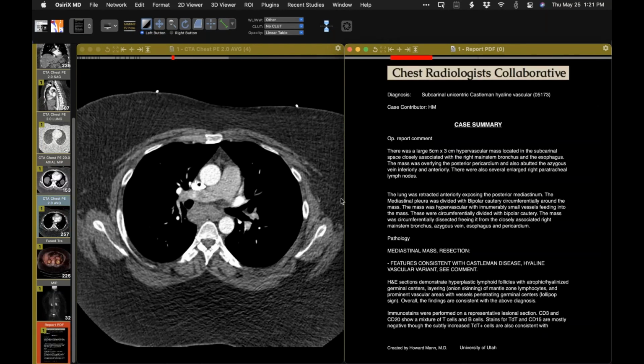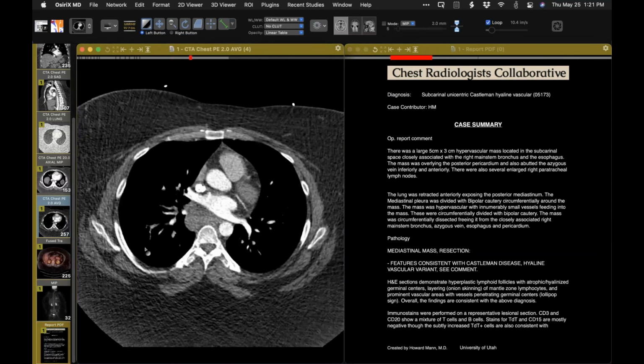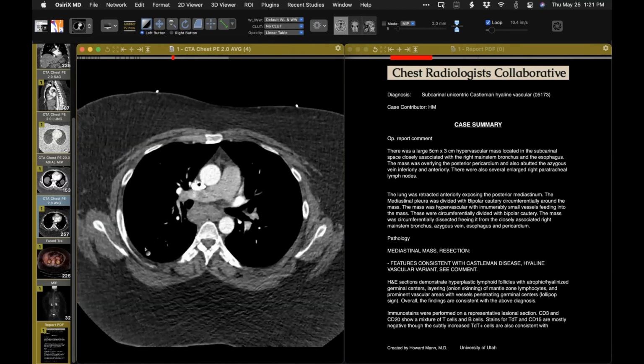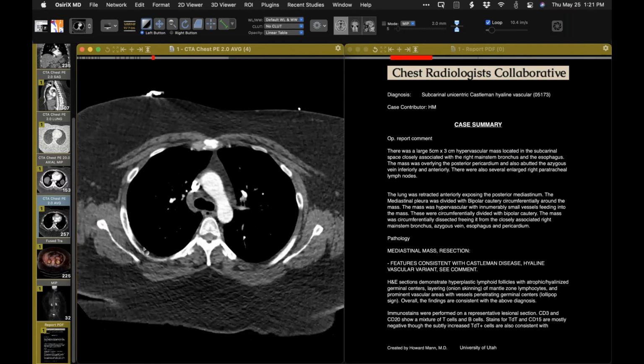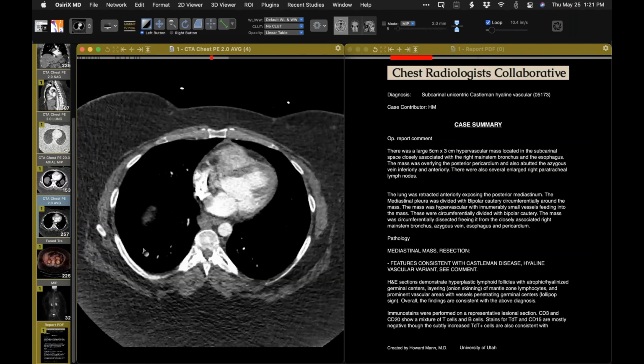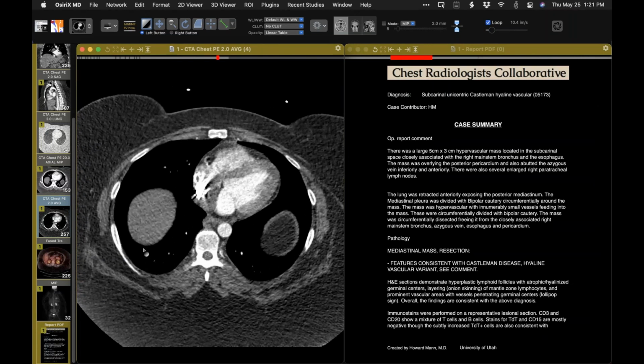It's interesting because the examples you sometimes see in some of the older books look like really hypervascular, but in reality, the handful of cases I've seen have always just looked like lymphomas with a lot of vessels, or lymphadenopathy that may be a little denser than normal, but they just have a lot of feeding vessels in them rather than something truly bright like maybe a carcinoid tumor.